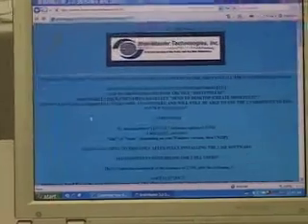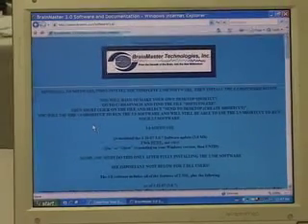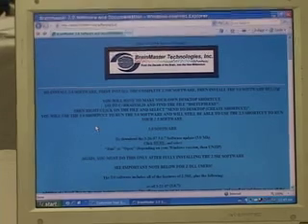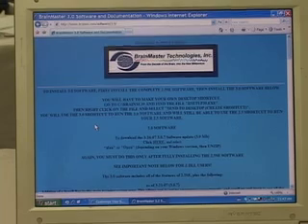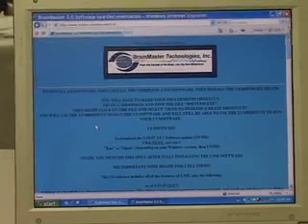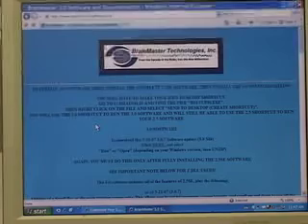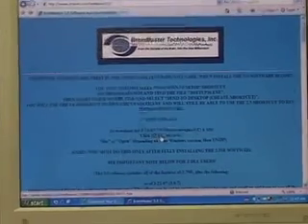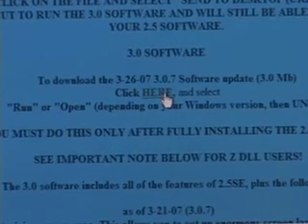Now, what will downloading the 3.0 software do? That will give you DCN 128 version 2. Version 2 of DCN 128, which contains the child database and other refinements, can only be found in the 3.0 download section. So once you download and click here, you will obtain the latest version of DCN 128.